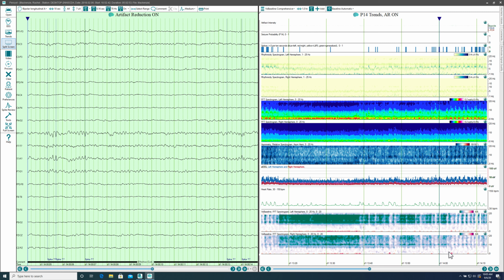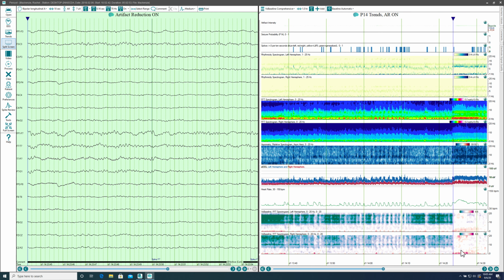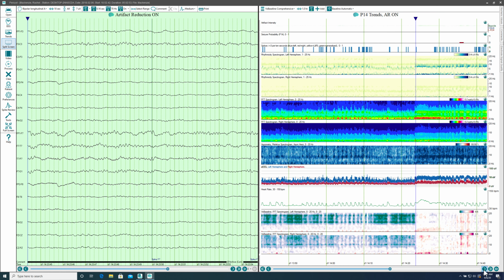As a result, they gave a test dose of mannitol around 1425 to relieve the intracranial pressure. After they gave the mannitol, it was 15 minutes later, around 1440, they felt the patient had somewhat improved clinically, i.e. the patient had regained the previous level of responsiveness. But the versus baseline changes show that the EEG improved immediately after the dose of mannitol.